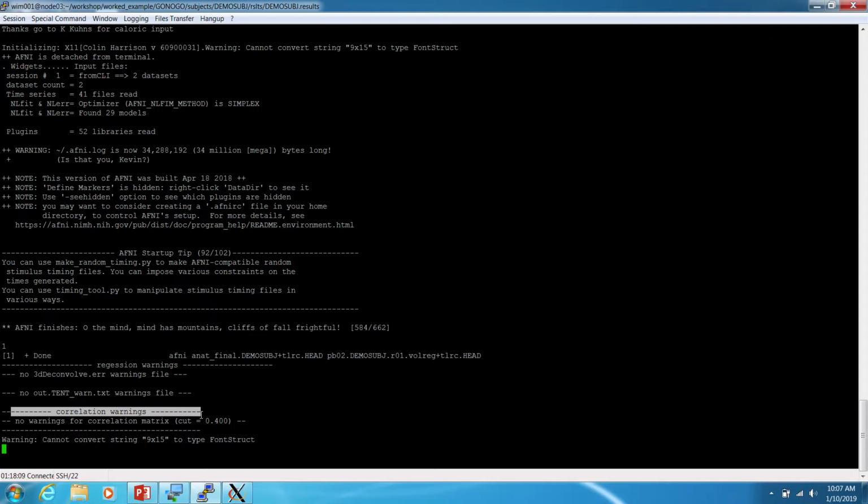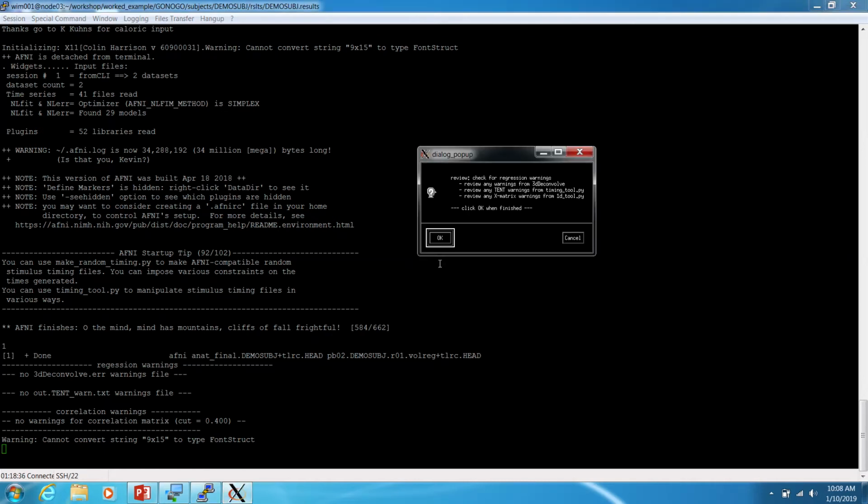If all of your regressors are highly correlated, your design isn't that great, and you're probably missing results. This is a common reason why we'll go in and apply jitters into our results, because it kind of breaks up the events so that they don't correlate to each other. I'm happy at some point to talk through that if you're interested, but we'll go ahead and move along. So we didn't find any warnings in that results. Usually at this step, we would often find problems, so it's pretty rare that we have issues with this.